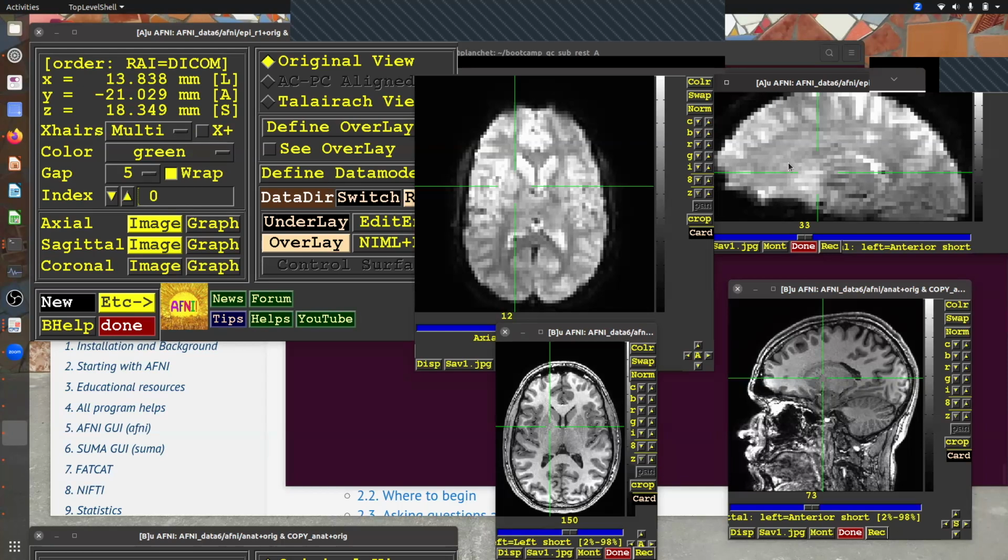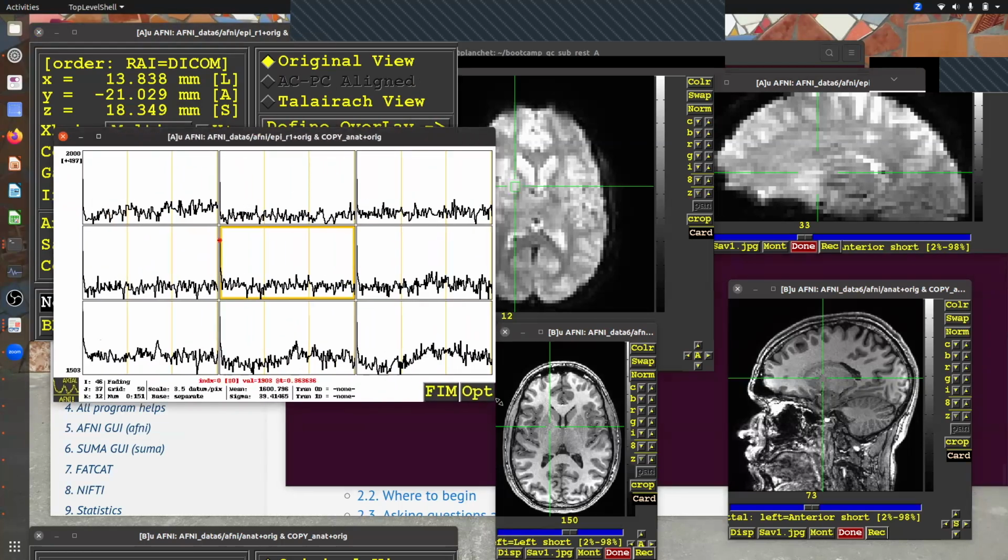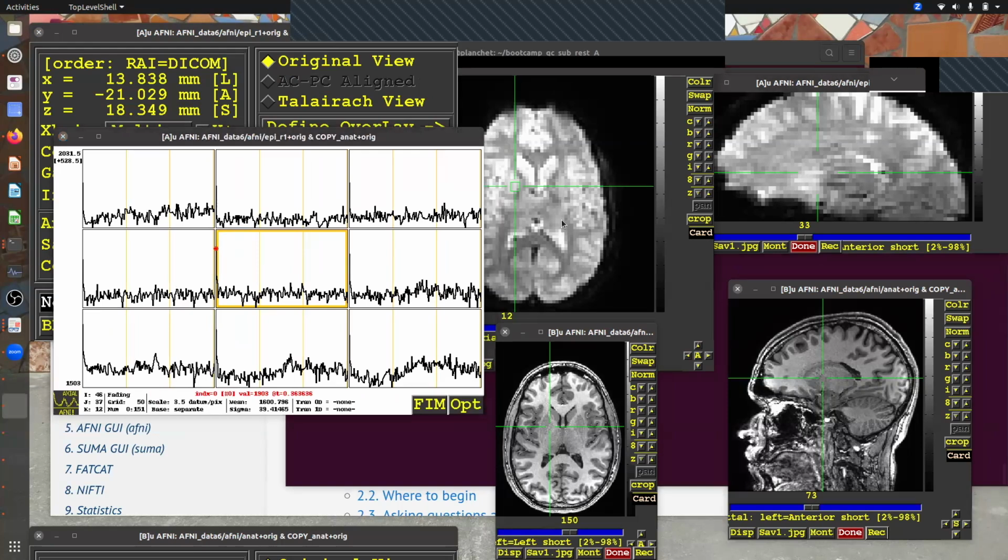Why are we even bothering acquiring this? Because everything we've said is kind of negative. Well, the reason is I can open up a graph window, and I see that in addition to this spatial information, that's not really what I care so much about here.